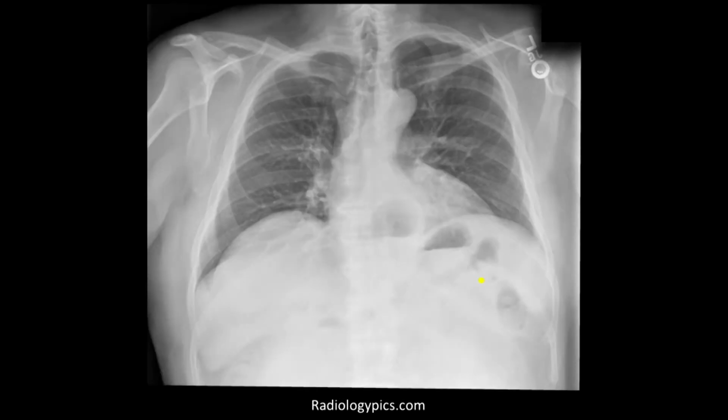Another patient with a small hiatal hernia, again you can see this gas within a hiatal hernia sitting behind the heart, and you can see here that they have a fluid level within, so a much smaller hiatal hernia. The gas that you're seeing here is probably within the colon of the splenic flexure rather than a stomach bubble.